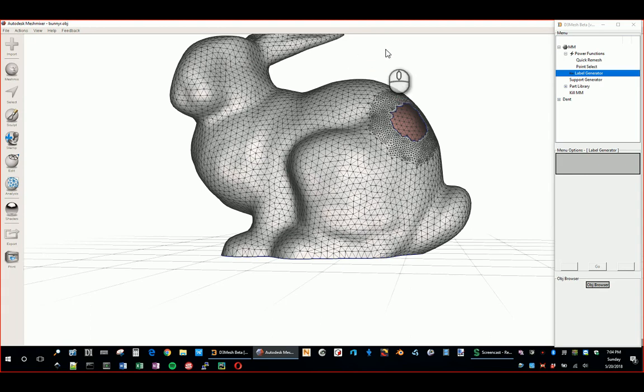I have no problem generating supports in the default software of the printers. In fact, it's probably the better idea. But this tool is here to generate the supports that will work best for each different printer. There should be a category for each different 3D dental printer that's out there, or the main ones, and the supports and bases that work best with that particular printer.